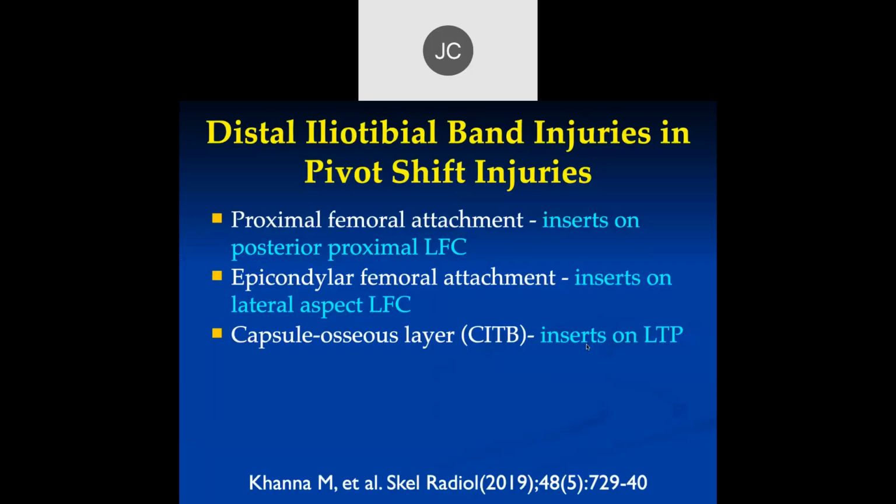Another thing that can be injured when you have an ACL tear is the distal iliotibial band. It's important to realize that the iliotibial band attaches to 3 different locations distally. One is called the proximal femoral attachment, where it inserts on the posterior proximal lateral femoral condyle, catty-corner to the adductor magnus attachment on the medial side.